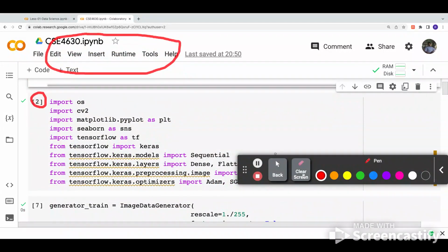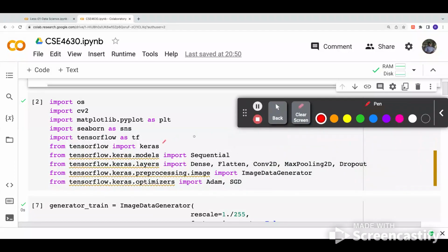So after this, we need some header files to accomplish our work. Don't worry about there being too many libraries or header files here. Every header file and library is very popular. You can easily search for them and find their structure. So once you understand which library files you require, you can easily use these library functions.